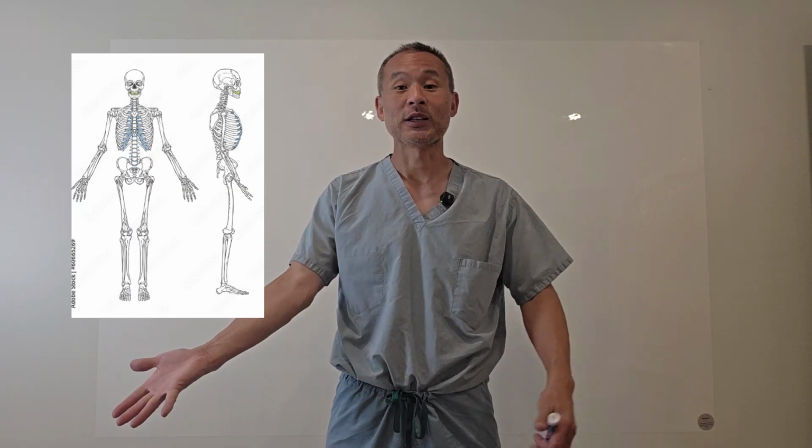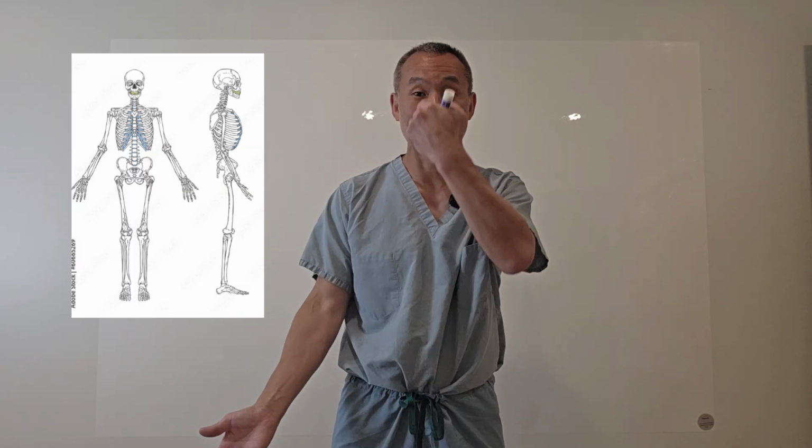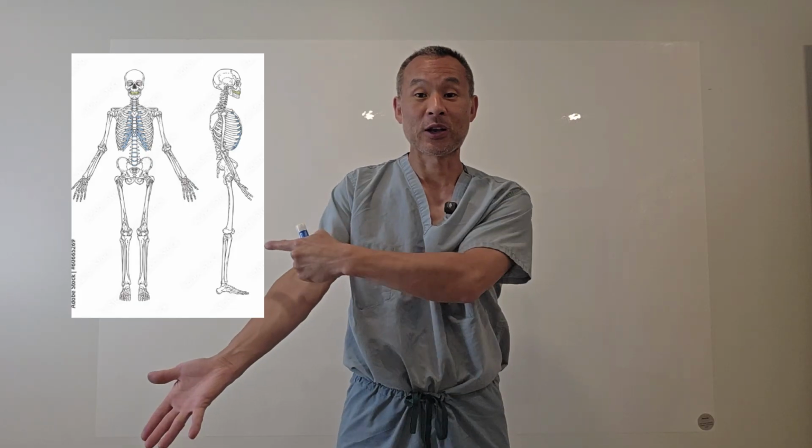So you have a fracture, you can describe whether it's displaced, whether it's mild, moderate, or significant, or non-displaced or minimally displaced. How do you describe which direction it is displaced? Well, that all comes down to the anatomic position, which looks like this, where your palms are facing forward and your thumbs are pointing out. So anything away from the midline is going to be called lateral, and anything towards the midline is going to be called medial. And on this view, anything that way is going to be anterior, anything that way is posterior.